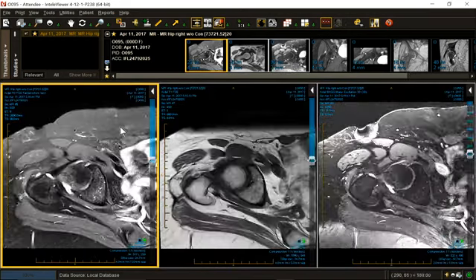Now, that would just be too broad for a sulcus. It's too complex looking, up high. Granted, the sagittal is more informative, but look how deep that signal is. It's almost through and through. I'll allow 50% depth for a sulcus. So that's another criteria. I don't want to see them too deep, and I certainly don't want to see them go all the way through, and they can't make cysts, and they shouldn't be inflamed. So that's a very complex tear.